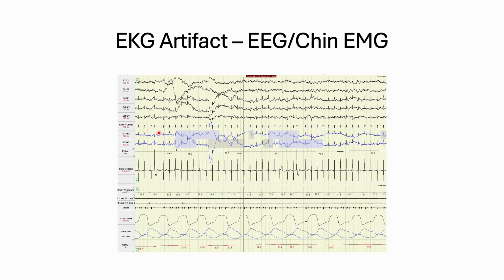There's either a blood vessel or some kind of pathway that really shows that up. So one thing you can do is, instead of using the mastoid bone for a reference, you can use the earlobes. There's nothing there. There's no electrical signals there. It's just blood pumping, so you're not going to get an EKG signal out of that. My boss used to do that, and he had some really great looking studies because he did that. So we've got EKG artifact.